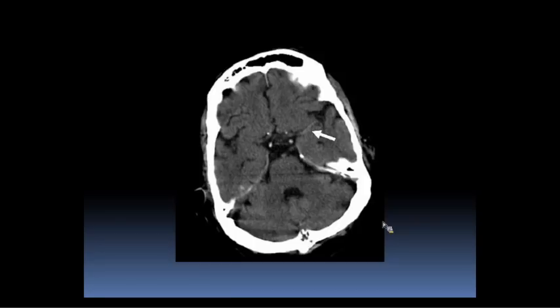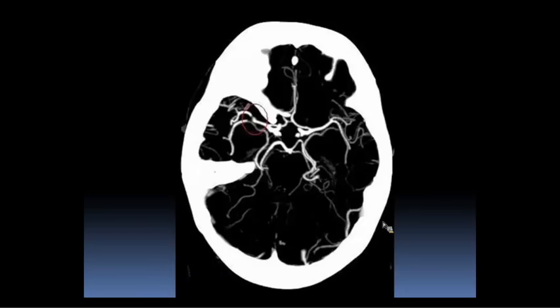So this acute clot is bright. It just is. It's increased density compared to flowing blood. So the rest of the vessels you're looking at have flowing blood. But there are some pitfalls here. So this is essentially what we're looking at.